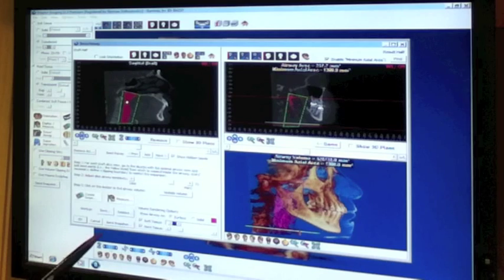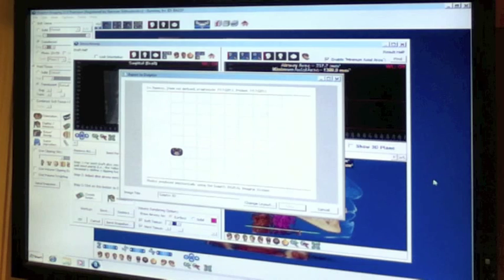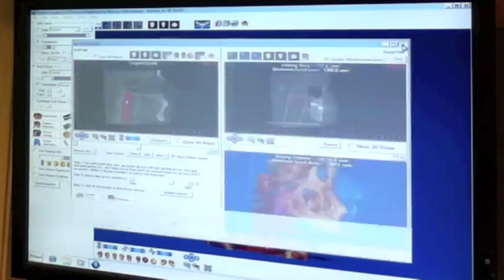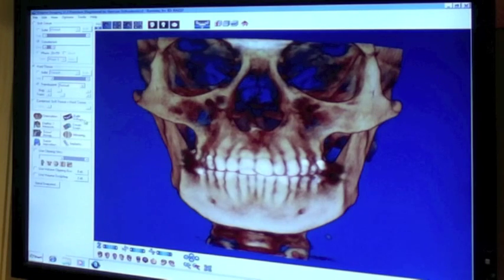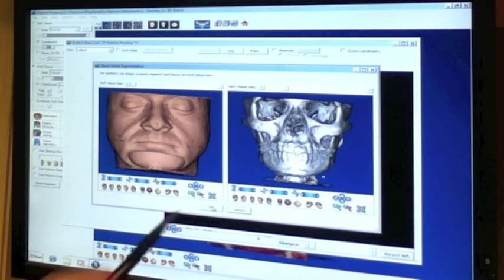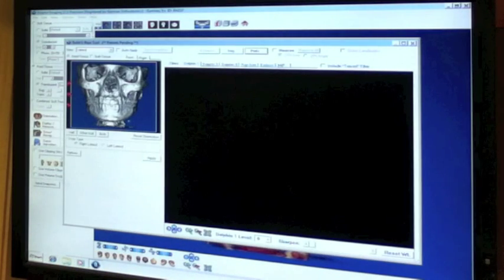And then once you're finished, hit Send Snapshot, Save to Dolphin Layout Database, and this one will go in the seventh box down, the very last box at the end of that row, as translucent volume. And then you can hit OK or X out of this window, and then you'll go into Build X-rays. Hit OK to go on to building the X-rays.